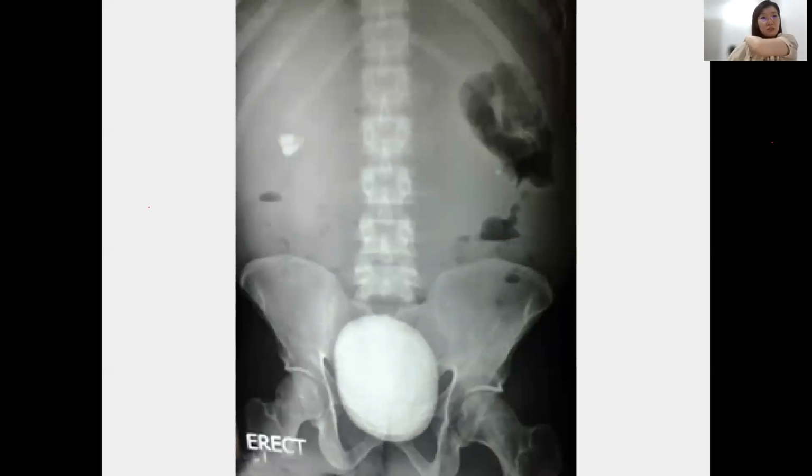Where is a stone? Yeah. Bladder stone. Yeah, this is a big bladder stone here. There's also a renal stone here. The bladder stone can really be this big, you know, because I have seen a real patient coming with a big, huge bladder stone.